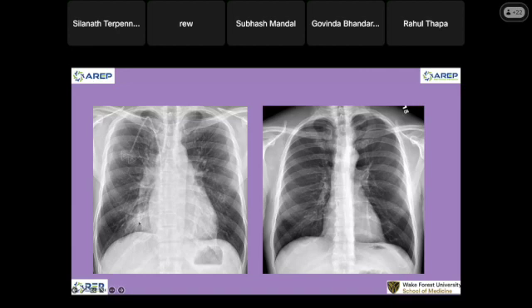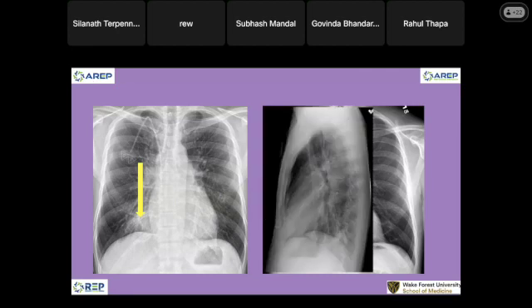So this is in the right lower lobe. The trachea is shifting, actually. Okay, I'm going to go to the lateral. Why is it shifting? I'm looking for something in the right lower lobe. Does this look normal to you? My right lower lobe is right here. This is abnormal because there's some density. So we just follow it up to the corresponding PA, the frontal projection that I see.